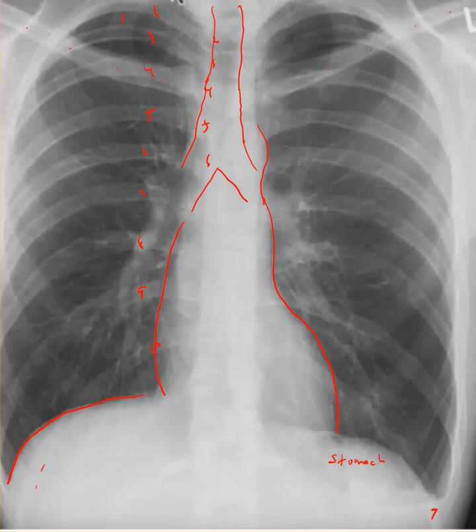So that's D. E is everything else, and the important part, your lung fields. And I'll start with the right, and I go down my lung fields. I can see that the hilar area is kind of congested, and also on this side as well. I look at my pulmonary vasculature, and it goes all the way out to the edge. So I can see lines and vessels and everything all the way out there, so I know that the right side looks okay. And I go to the left side, and right off the bat, it looks a little different. Let me get rid of these so we can see better.